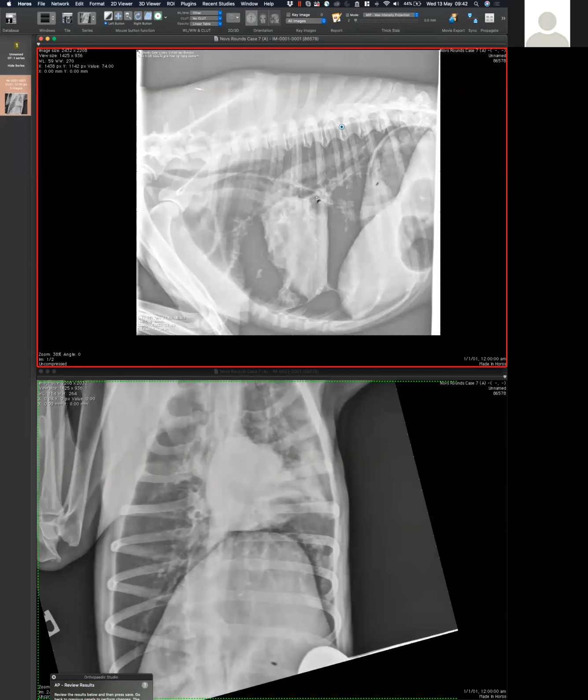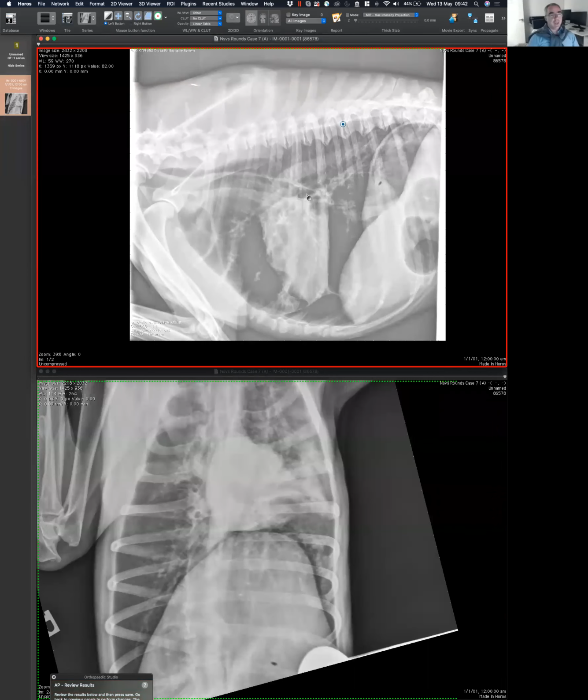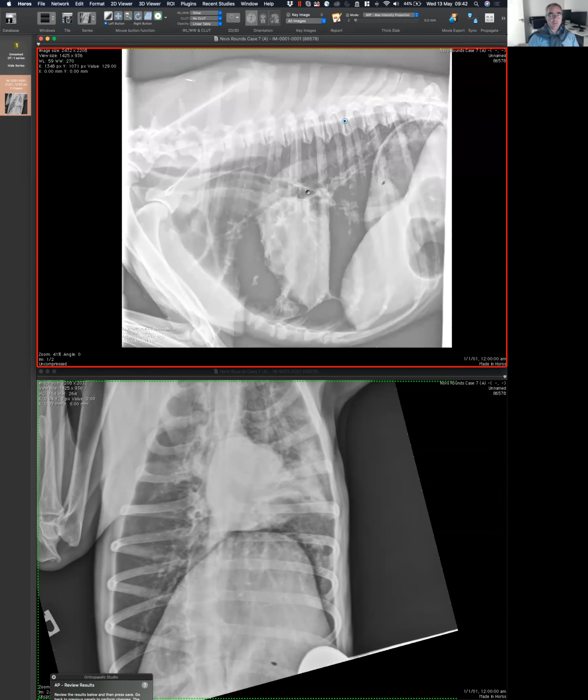No, I didn't take that one. Sorry. Blame it on the nurses. Can you guess? I know which one it is. Oh, that's the crus of the... yeah. The crura are important, but I can't remember which one is which.